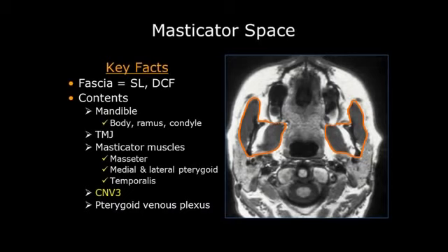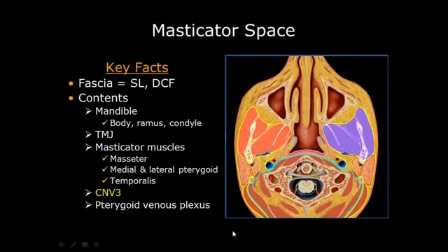The four major muscles of mastication are there. We have the cranial nerve V3, again, perineural tumor to think about, and the pterygoid venous plexus is here, which can cause a pseudolesion. And so we see the lateral pterygoid, medial pterygoid, temporalis, and masseter muscles, and the mandible, the pterygoid venous plexus here, and V3, I think can be, I'm having a little trouble seeing it there, I think it's right here inside the fascia.